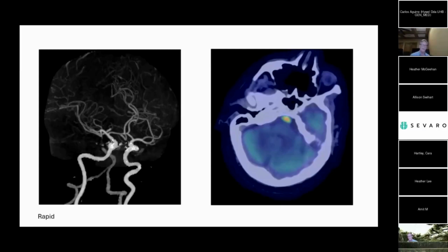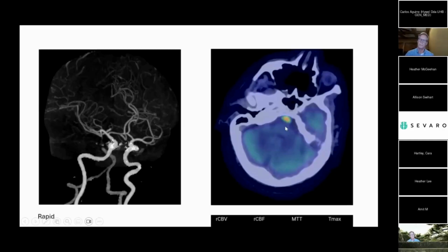They gave me another case. Remember I told you posterior circulation strokes can be a challenge? Well, they gave me a case to prove to me and to you that they actually can do that. So in this case, we have a coronal image. It's kind of oblique. Here is the basilar artery coming up, and then it just stops. So there's a thrombus sitting right there. They have what's called a heat map, which tells you their confidence level that there's a thrombus there. And this thing is orange, which means they know there's a thrombus there.